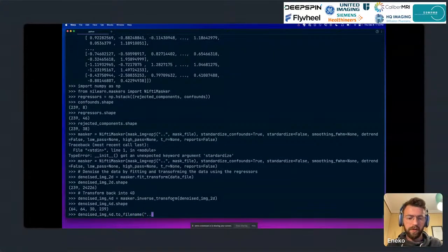You could do it in the functional folder if you wanted to keep using this denoised data in your analysis. So I just copied the name of the file I'm going to use. So aggressive denoise bold. And so this would be the aggressive denoising.